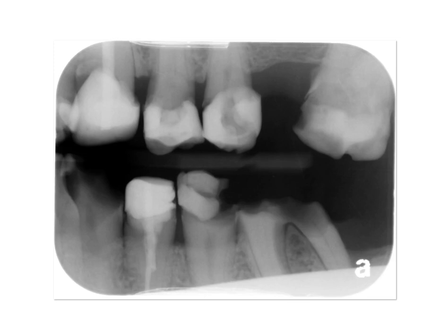This is Dr. Kim. I would like to go over two sets of CMS, pointing out important landmarks that you need to know for tomorrow's test. So let's just go over multiple radiographs. Hopefully this is helpful for you.